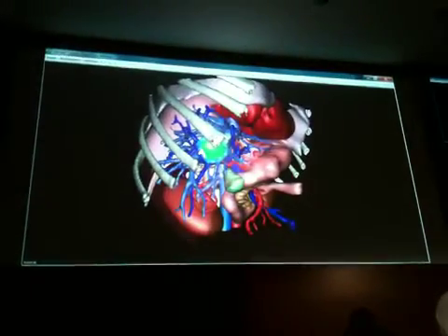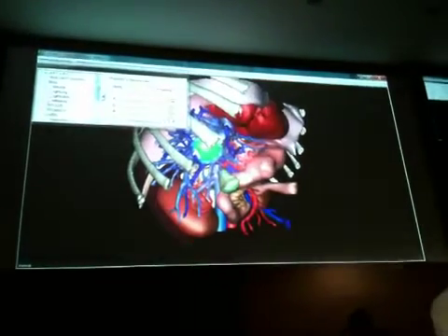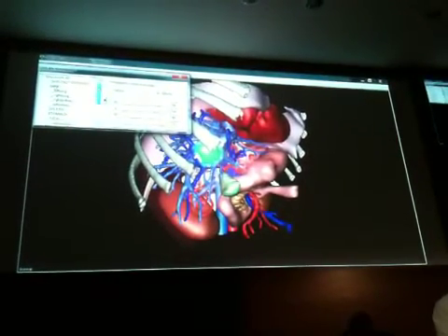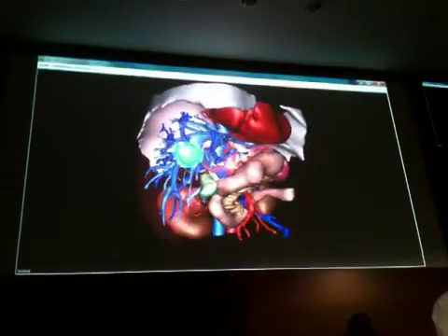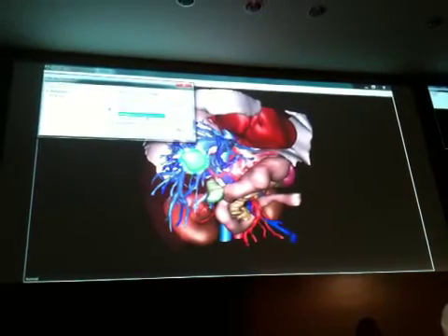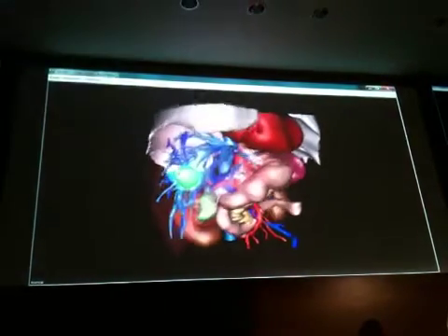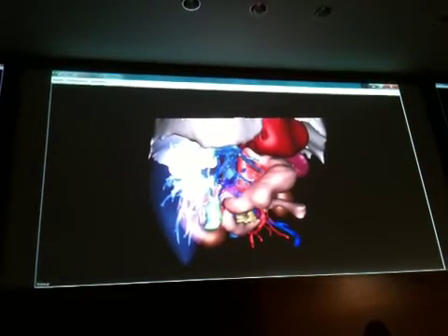Here you know that for the liver you mustn't cut more than 70% of the liver. For the first tumor, you can also choose to reduce this security margin. What is important here is to resect. So we will resect the patient virtually to see if I will have enough liver after resection. It's really easy to do. You see, I select 3 points that define a plane.